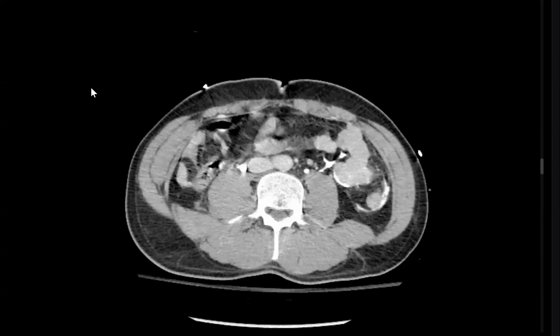More delayed. Yes, so there are multiple areas of contrast seen within the bowel, so portal and excretory will not be enough. We need far delayed. Okay, so complete your comment: this is intraperitoneal urinary bladder injury given the contrast seen between the bowel loops.